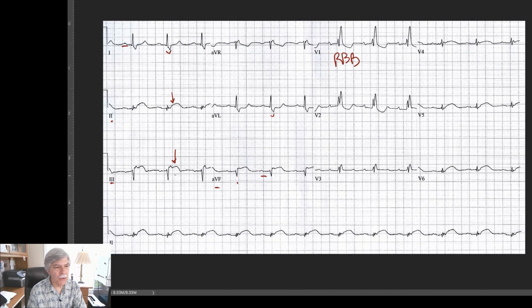He has at least 2 or maybe 2.5 millimeters of ST segment elevation. And you could even look at V2 with a tall R wave and very little S and some ST depression here, and that may be even a suggestion that the posterior wall is involved.